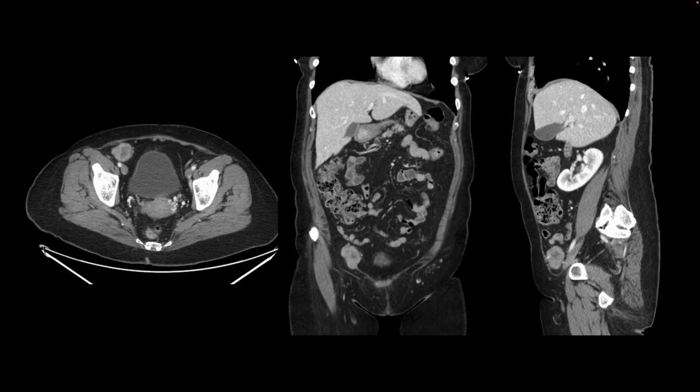Here's our first patient, a middle-aged female who presented with a CT scan of the abdomen and pelvis, and incidentally, an enhancing mass was seen in the right lower quadrant, right there next to the inguinal canal. And so, what could this be? It could be a tumor. And on the CT, we cannot say much more than that.